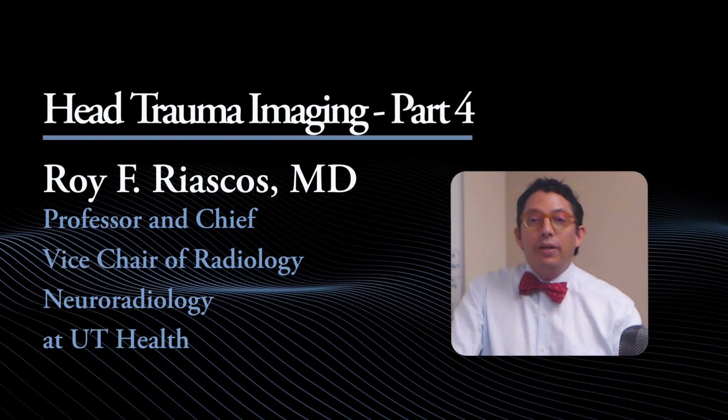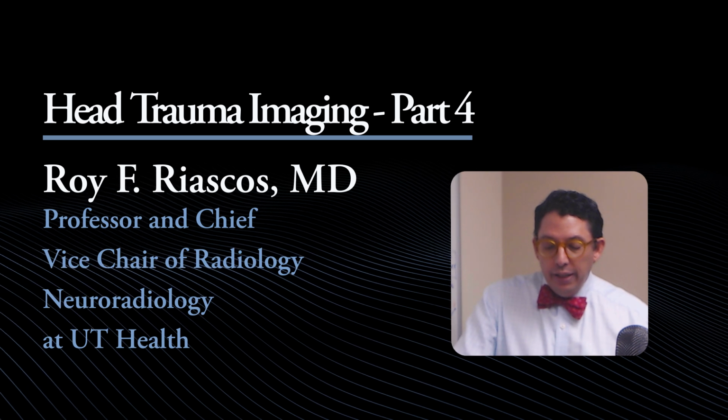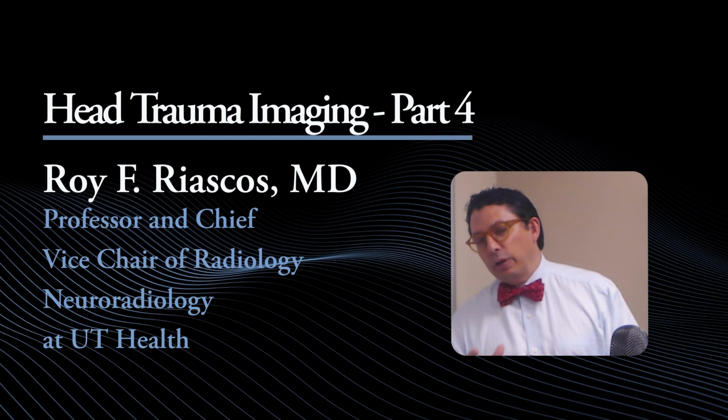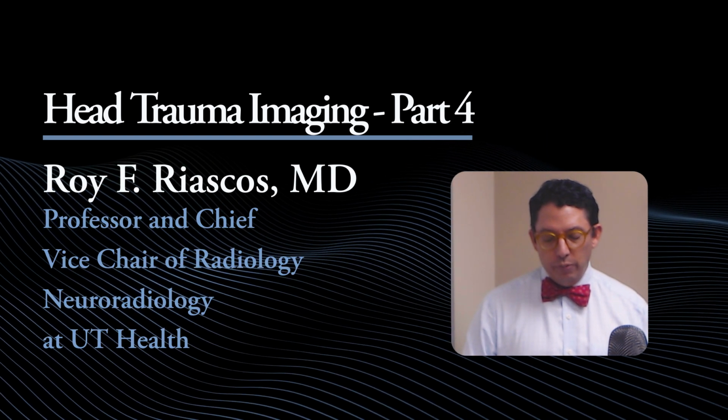Welcome to part 4 of the brain CT trauma lecture, where we're going to talk a little bit about other lesions. We're going to go back to the parenchyma to study a very specific scenario of parenchymal hematomas. And we're going to start with this case.